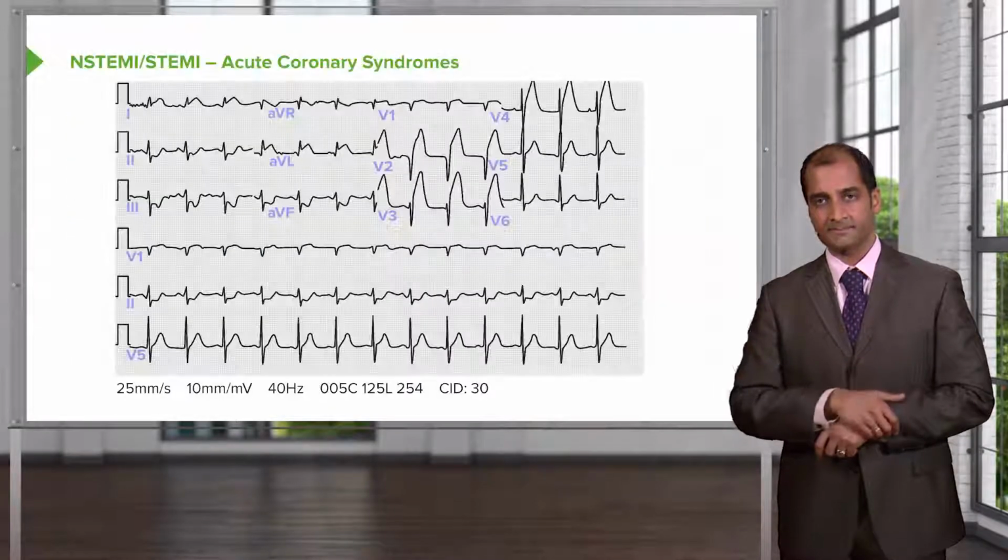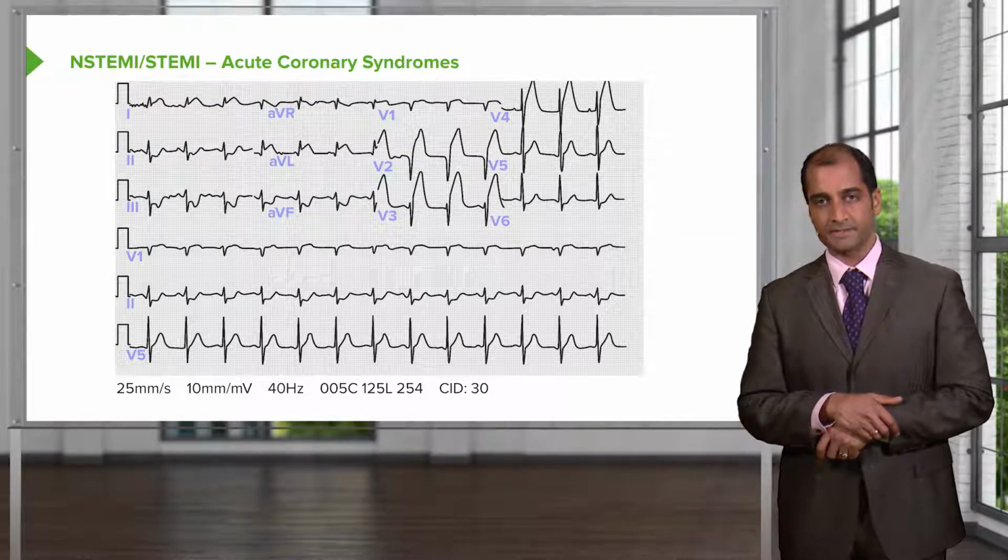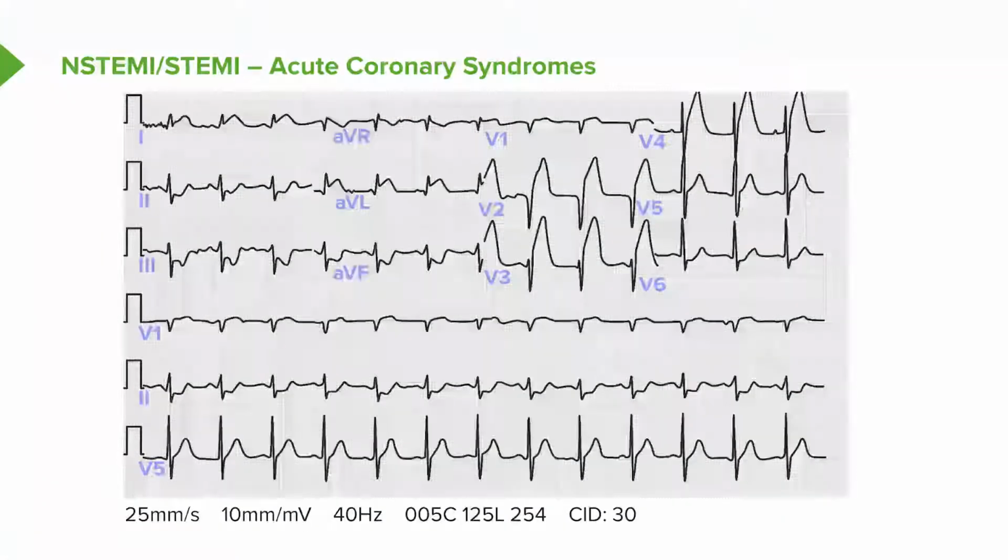Now, with that said, let's take a look at ST elevation here. And if you focus upon, please, V1, V2, V3, approximately in the middle of that page of EKG, you'll notice that this would be an ST elevation. You see that crazy concave type of ST elevation. You can't miss it. Huge, massive, specifically in those precordial leads. Which coronary artery would this be? Left anterior descending. Is that clear?